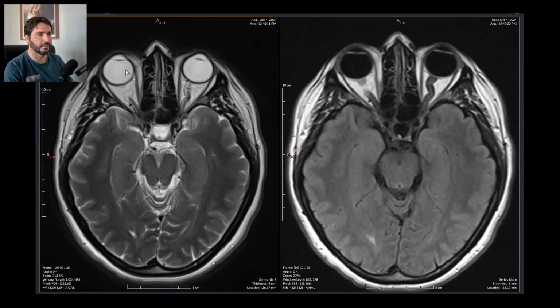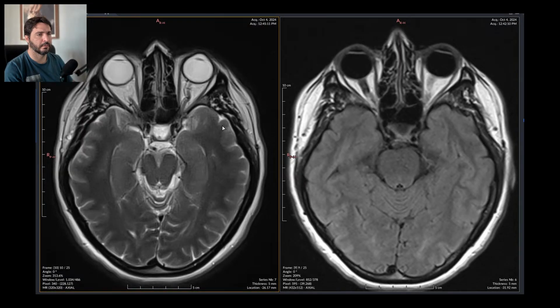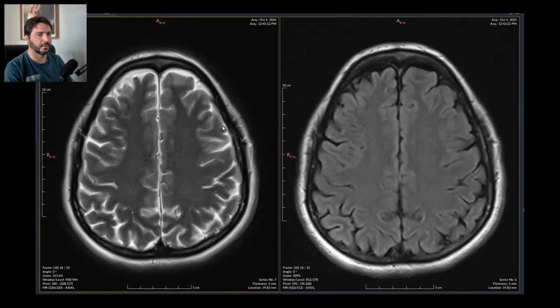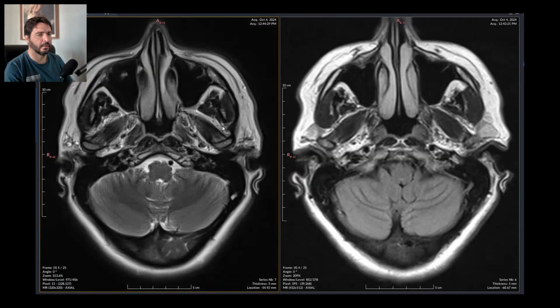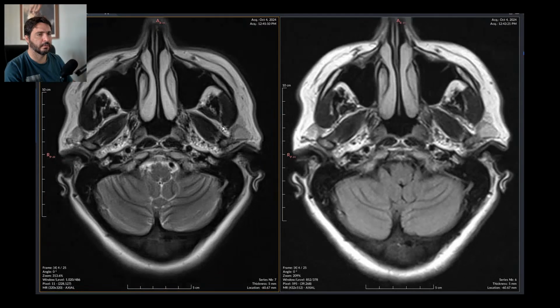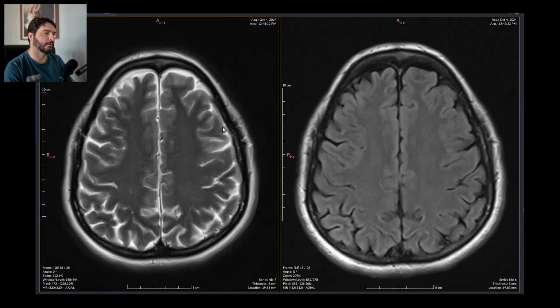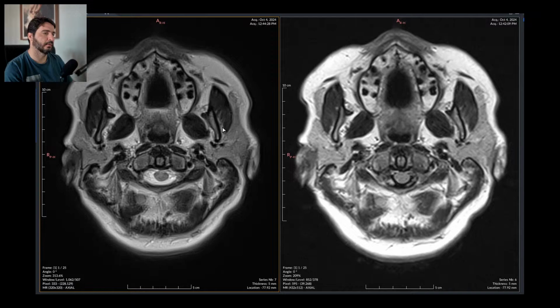Orbits, patient has artificial lens. That's fine. We are all going to have it, if we live long enough. Especially people like us who watch too much TV, stare at screens all day.